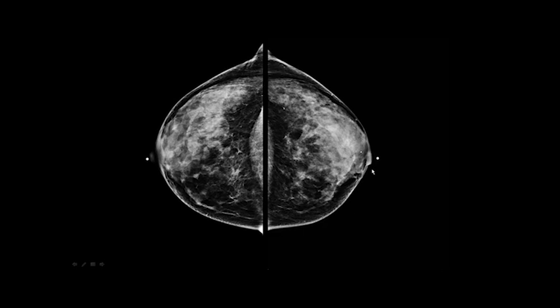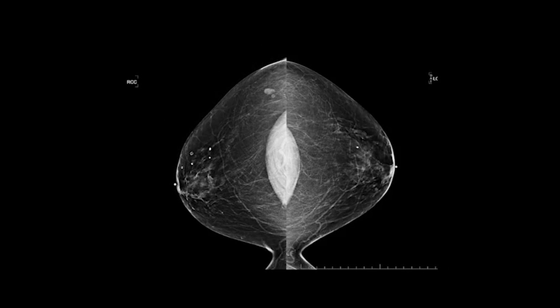So these are good. This could have been improved a little bit, but it's not bad at all. I would send these in. These are beautiful, beautiful accreditation images. We've looked at these before. You want to try and get muscle in accreditation images. You want that medial tissue, lateral tissue. You want your nipples perfectly centered.